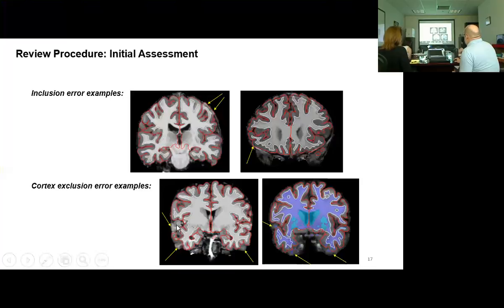This is Heschl's gyrus, primary auditory cortex, superior temporal gyrus that's nearby, planum temporale here. So this area is huge. It's one of the top two most important areas for us that we want to be accurate. This, and I would say inferior frontal gyrus and premotor cortex.